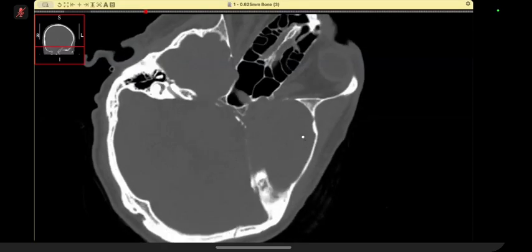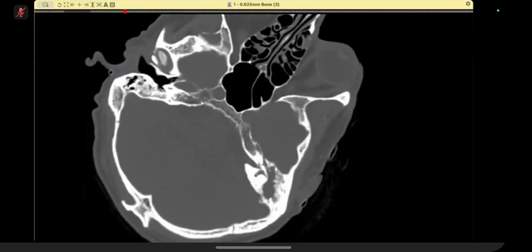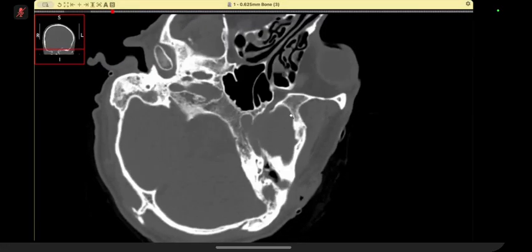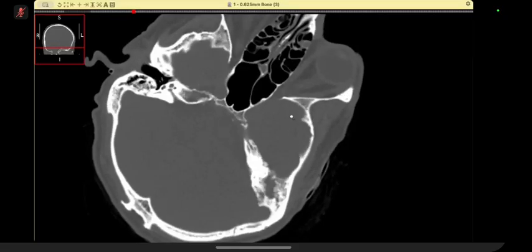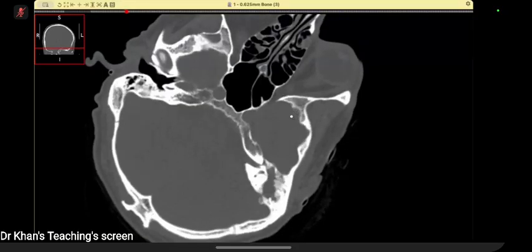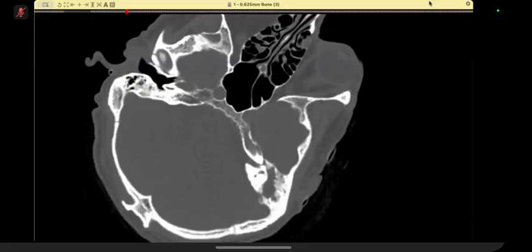Sir, I would also like to see the petrous apex, which is normally seen. So the epicenter is in the middle ear cavity and in the mastoids, with part dehiscence of the posteriormost part of the mastoid air cells. Yes, the focal loss of bone is there, sir. I would like to see the images on the coronal as well.